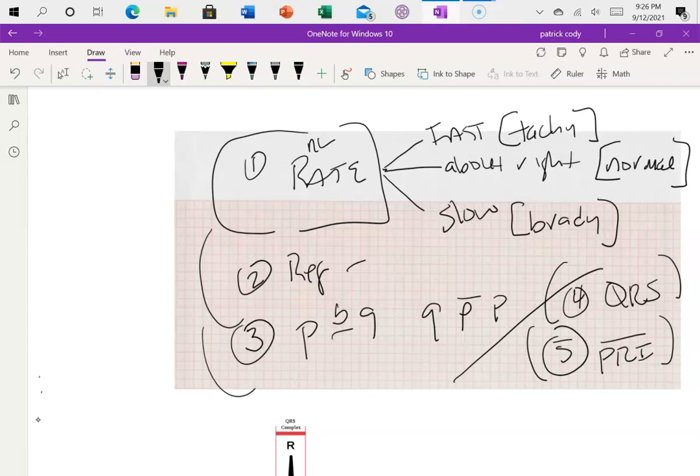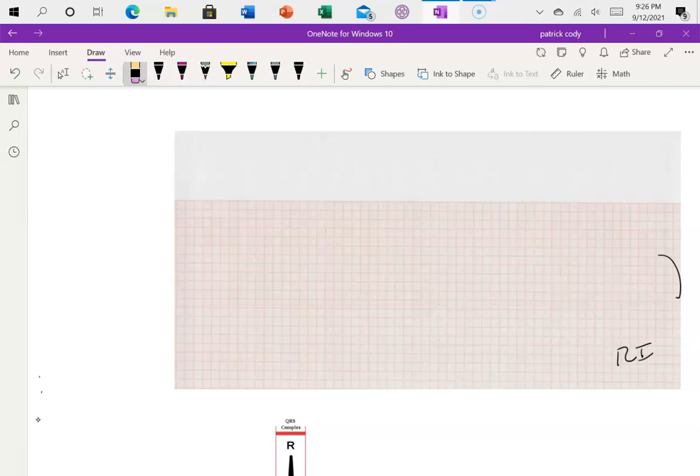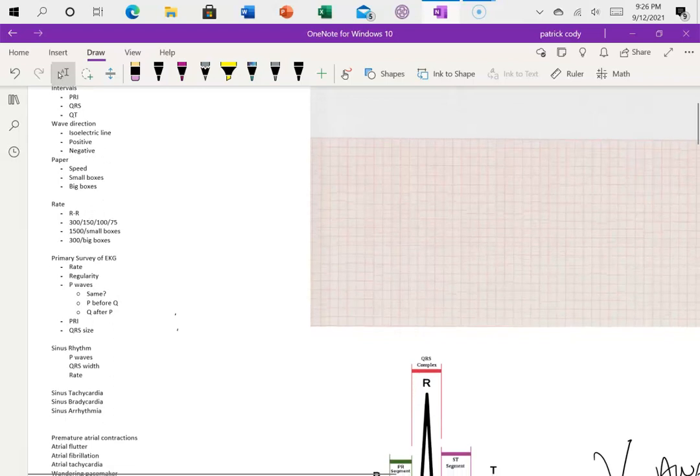And so I want to make sure that we don't miss those as we're looking at the ECG. Okay, but remember, look at the rate first, because the rate's going to be very important in the care of your patient. And one of the things that's important clinically is for you to correlate the rate that you see on the monitor with what's actually happening to the patient. So check their pulse, because as we've learned, not everything that appears to be conduction on the paper is causing mechanical capture within the patient's myocardium.